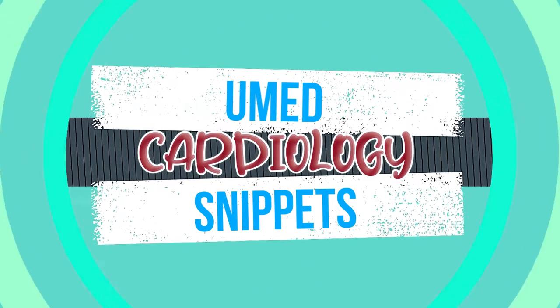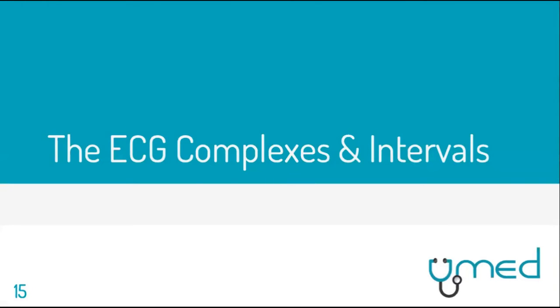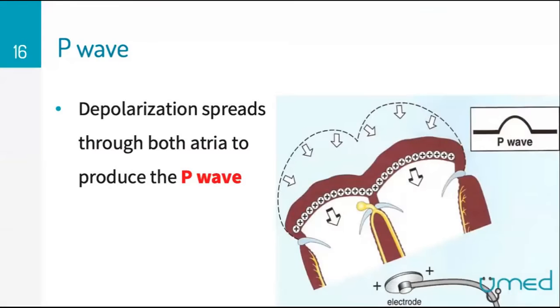Right. So let's talk about the complexes and intervals. Then we're going to incorporate the ECG into all of this. Some of the stuff I'm going to mention is literally a recap of the last class, but I'll dive into it a bit more, as well as showing some ECGs, right?